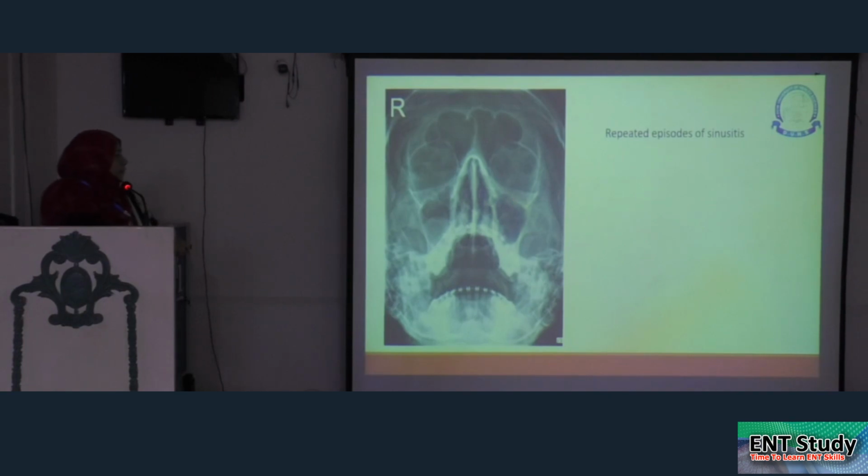This is the X-ray of a patient with repeated episodes of sinusitis. The X-ray shows a well-defined opacity in the right maxillary antrum. This could be a maxillary mucus retention cyst, or it could be a sinonasal polyp, which should be evaluated further with either CT or MRI.